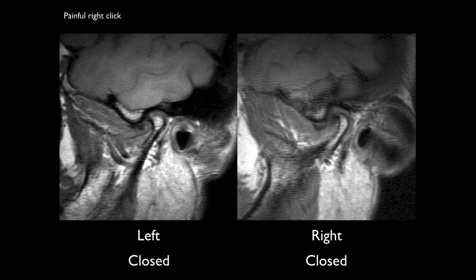Well, they're closed, and the condylar head appears to be articulating where I would expect it to be. Okay, so the condylar head is up in the mandibular fossa here, but notice it's much higher than what we saw on the others. Yeah, it's actually clenched, maybe contacting the bone. And here, it's more posterior than we saw on the others, and also maybe a little high, with maybe a little bit of fluid up here.